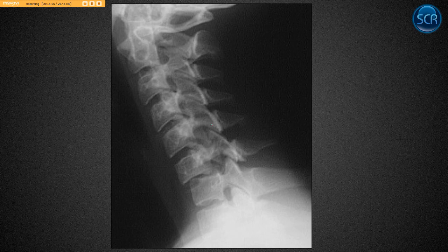Here's another example of a case of trauma. ADI, can't really tell that well. We follow George's line down, come down here. Oh, there's a spondy. Okay, so a traumatic spondylolisthesis in lower cervical vertebra is going to indicate some type of facet injury typically. And so we look back here at the facet. We see this one's got some gapping back here. It's widening. Interspinous distance is widened. You know, there's a focal kyphotic change here.